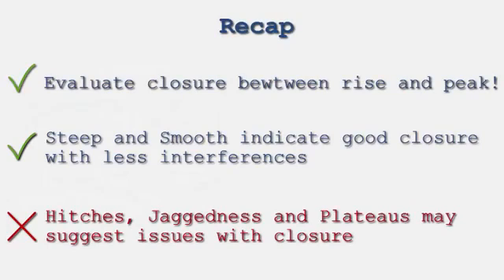In recap and review, evaluate closure between the rise and peak, and it is positive to see steep and smooth black force lines. Hitches, jaggedness, and plateauing may indicate issues with the patient.